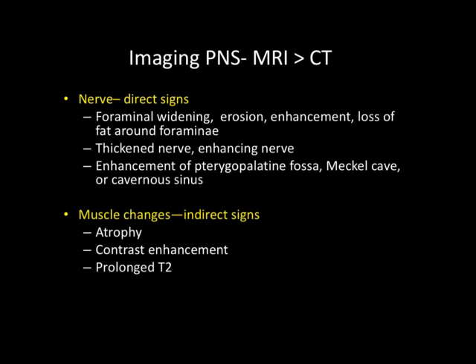So we have seen some cases where you have mild hyperenhancement of the foramen rotundum or foramen ovale, but that is due to the feeders which are along that particular foramen. So it need not always be true. Even in parotid malignancies you can have hyperenhancement along the nerve, which is actually because you're looking at the retromandibular vein. There can be feeders and draining veins along that area which can mimic perineural spread. So hyperenhancement along the nerve course is suspicious but not a definitive sign.